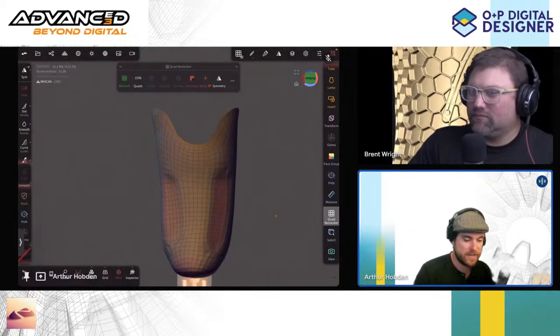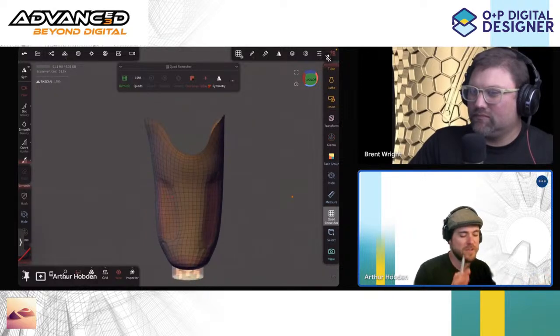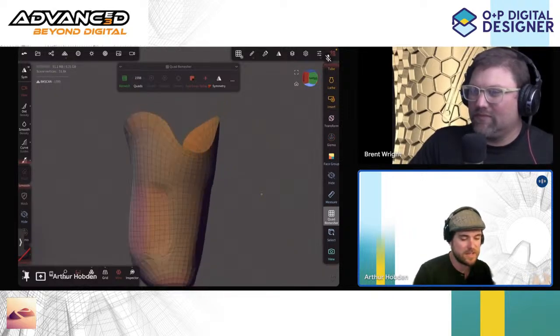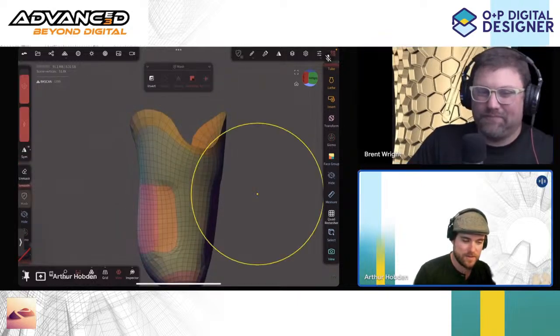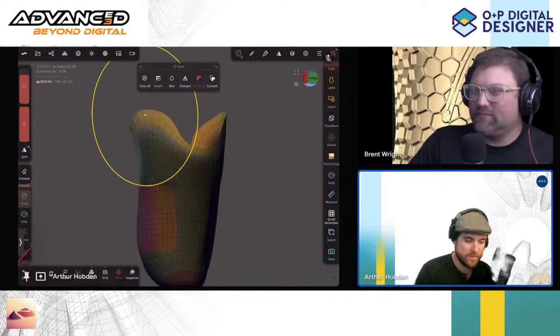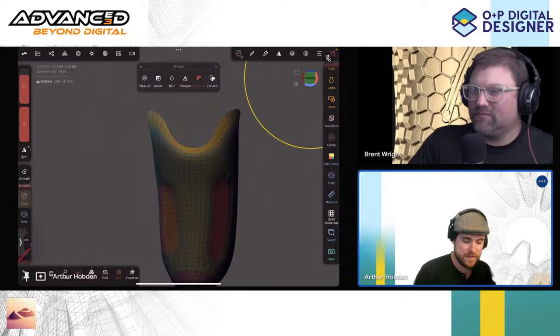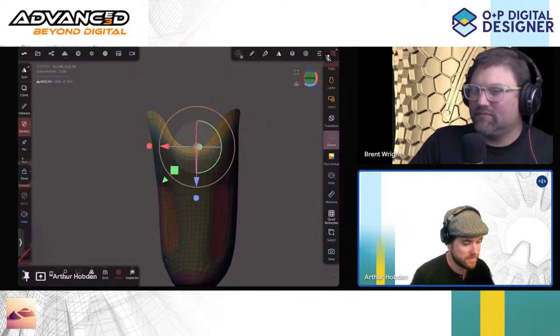For example, that last modification I mentioned, where we wanted to move the wings and bring them in. Remind me what the official term for that is. ML, yeah, the ML or, gotcha, supracondylar. So let's mask by group. Let's select the group. Let's invert, or blur and invert. Now that we have this in place, if I were to do this with really high density meshes, you would get a harsh line, but with this low density mesh, we can do that gradual modification and then just bring back the resolution after.